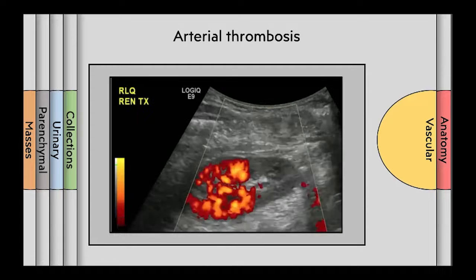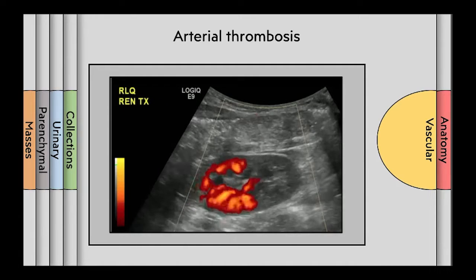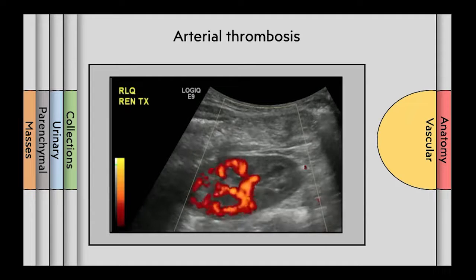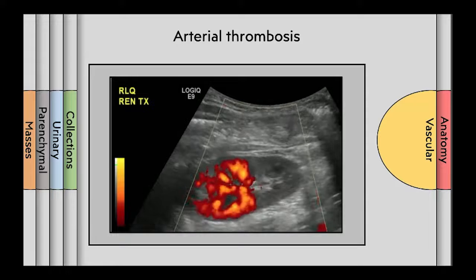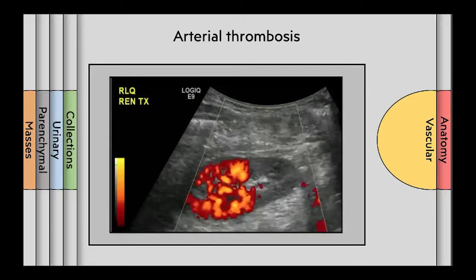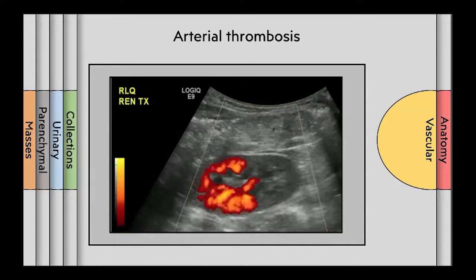There can be situations in kidney transplantation where a kidney graft may have several renal arteries, only one of which may be thrombosed, or when there is thrombosis of a segmental branch. In this particular case, we can see flow only in the superior and mid portions of the kidney graft. Noting the location of the infarction and the size can help transplant surgeons and nephrologists determine outcomes. The inferior pole branches have classically been associated with blood supply to the ureter, and inferior pole thrombosis may need closer evaluation to ensure the patient does not necrose the graft ureter.